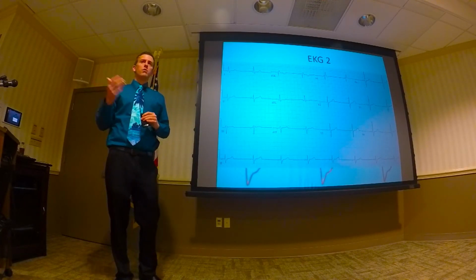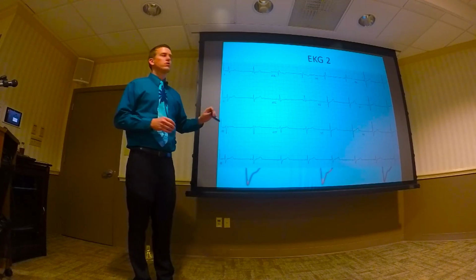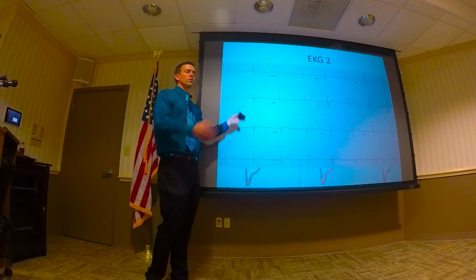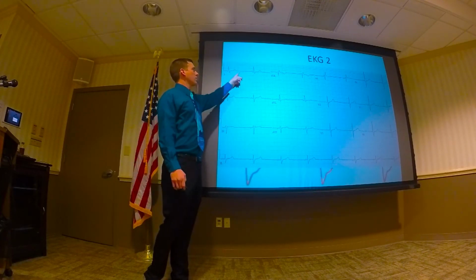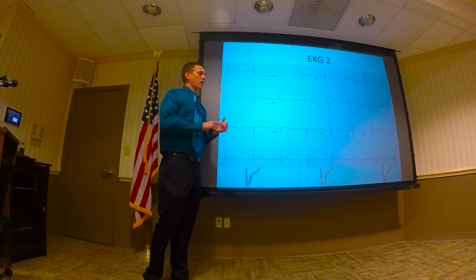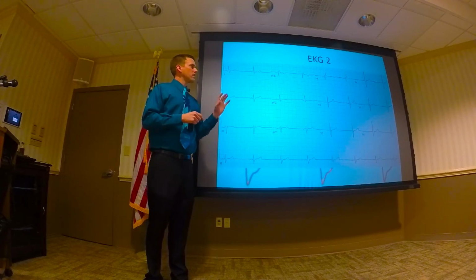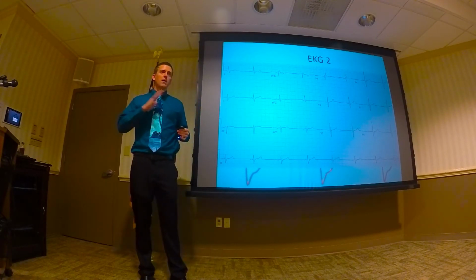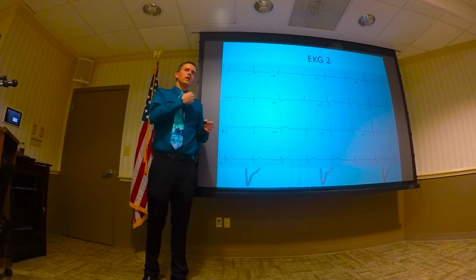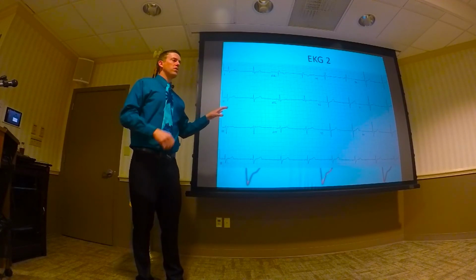Quickly, a caveat about any EKG interpretation, and the same thing when you're looking at Holters or rhythm strips on the floor: there are exceptions to everything. So you can say that I think this is ectopic atrial, or I think this is sinus if you're looking at a typical sinus with a P wave upright in 1 and 2. And like I said before, you have to know that the electrical part of the heart has to go with the mechanical. But the other part is that a sinus P wave looks like it's coming from the top down. You could have a focus right next to the sinus node that's firing, and it looks just like sinus. So there are a lot of things that mimic what we would think are normal.